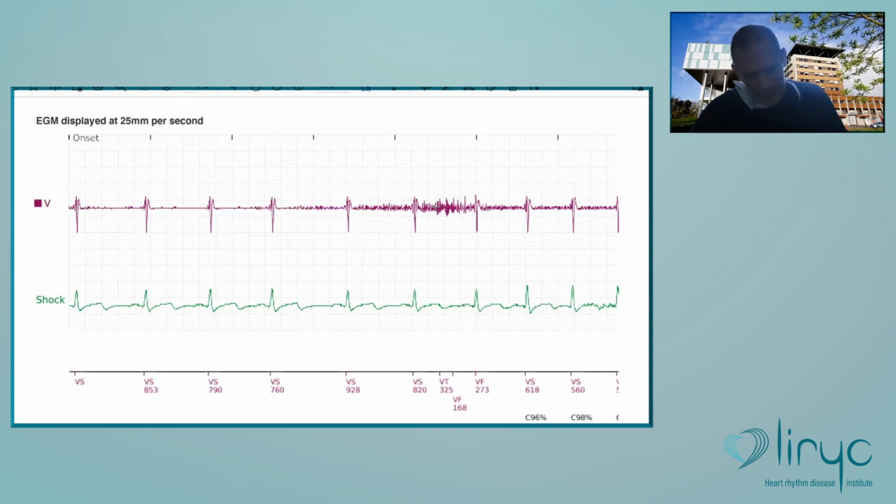If these two are quite horizontal, then you increase the risk of diaphragmatic oversensing. So the same in many books, textbooks, the problem of diaphragmatic myopotential is illustrated with the Boston Scientific device. The risk is increased clearly with this kind of leads. But in this situation, the lead is not dysfunctional. It senses something it should not sense.